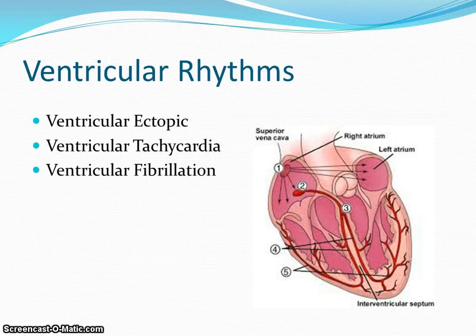There are 3 main ventricular rhythms. These are ventricular ectopic, ventricular tachycardia, and ventricular fibrillation.